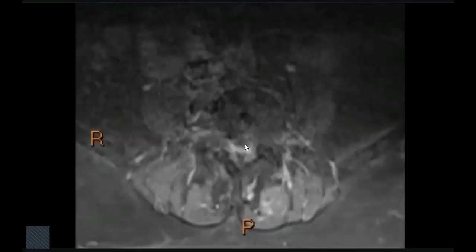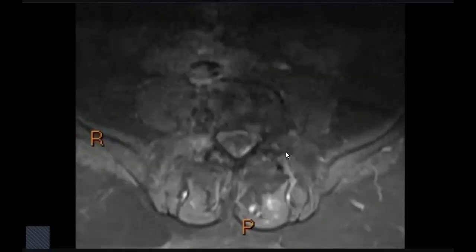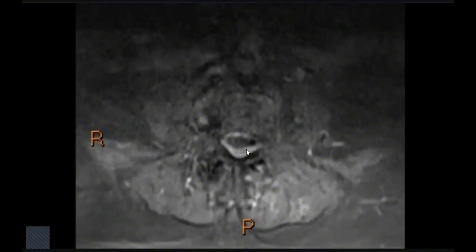These are the nerve roots in here, and some others are clumped in the posterior, and the enhancement around here is the epidural sac and the septations that we saw before. So the cauda equina nerve roots are grouped all together in the thecal sac, giving the pseudocord sign, with enhancement of the dural sac and the septations and enhancement around the nerve roots themselves.